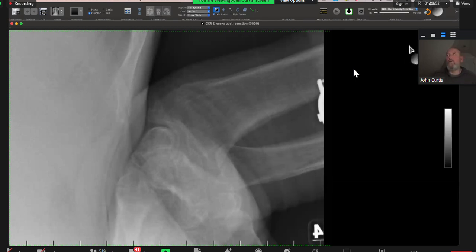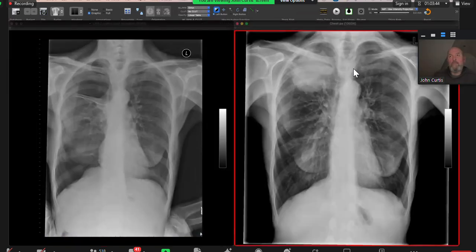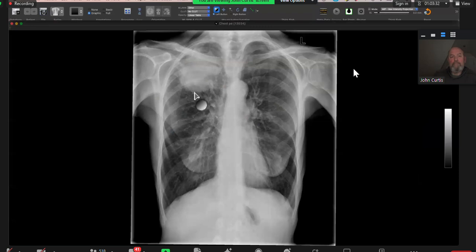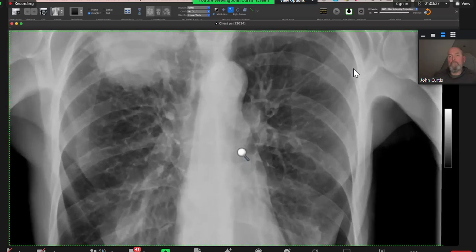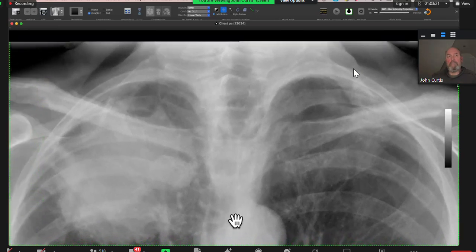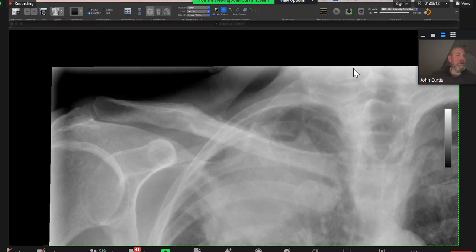Okay, so put it all together. This is a case of lung cancer, with a lobectomy and secondary complications of hypertrophic osteoarthropathy. Can you see it on the original film? On the original film, I can't really appreciate any. Oh, on the clavicle, there is some periosteal reaction that can be appreciated on the mid to distal clavicle. Okay, that's good.